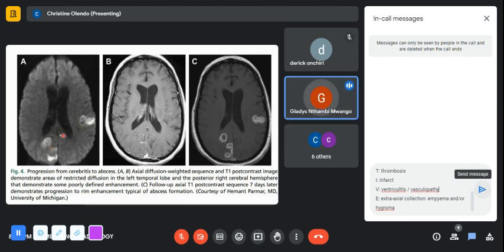So actually, what would you say in your reporting? You'd not be saying hyperintensity. What would you be saying? You're saying areas of diffusion restriction, right? You can see it's really an adequate DWI because the CSF is darker. So they have tried to remove all the T2 effect, though one could always look at the ADC map to correlate. And those areas which had the diffusion restrictions are the ones which are now enhancing on the T1 with contrast.